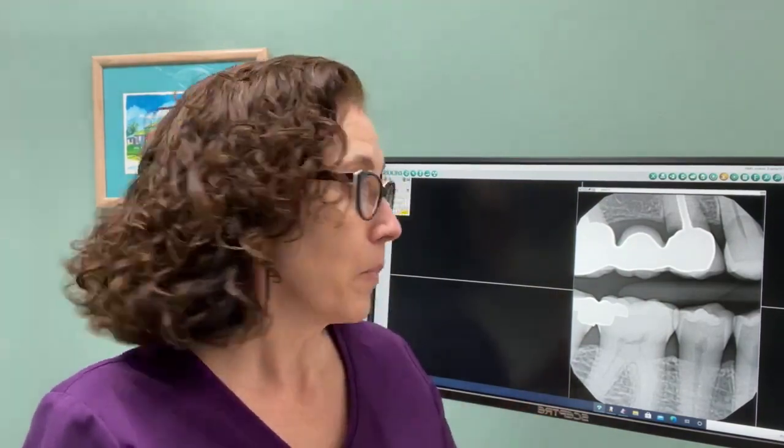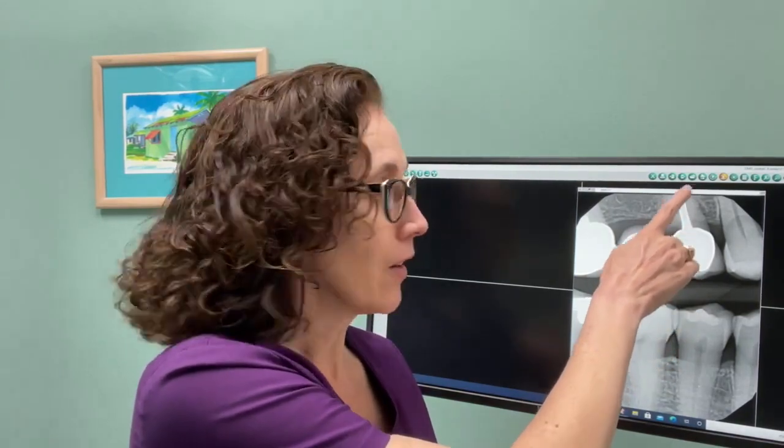But in this example, you can see the dark shadowy area right there that is underneath the crown. So this is actually a bridge. That's a crown on the tooth, and that post right there is from where a tooth has had a root canal. But that dark shadowy area on the back side there, that's the decay.